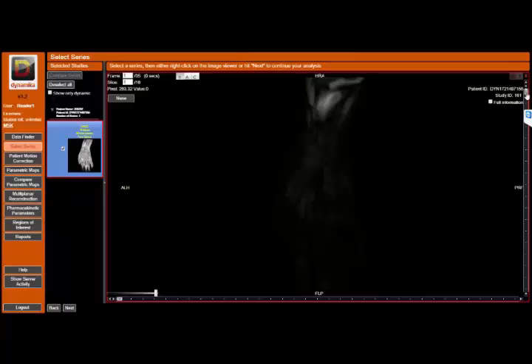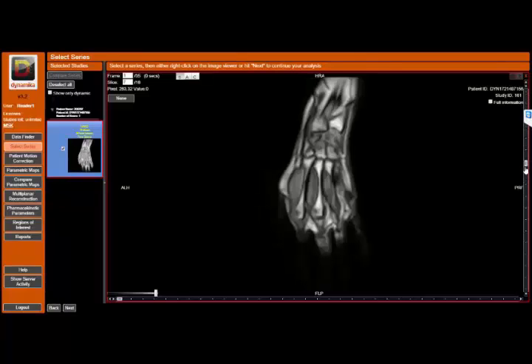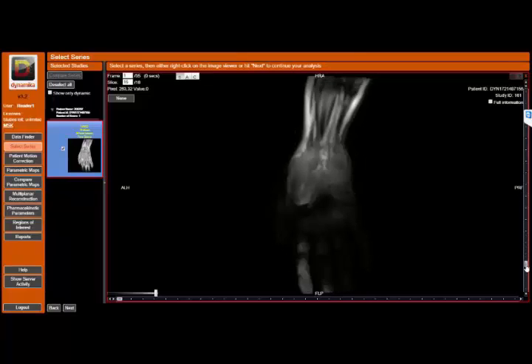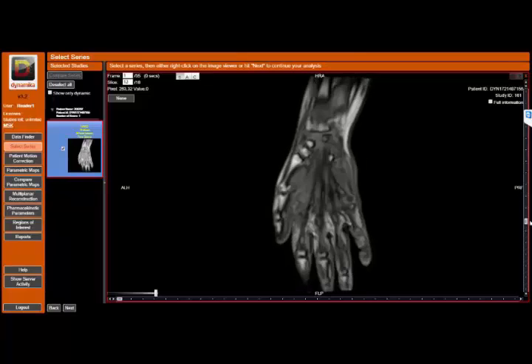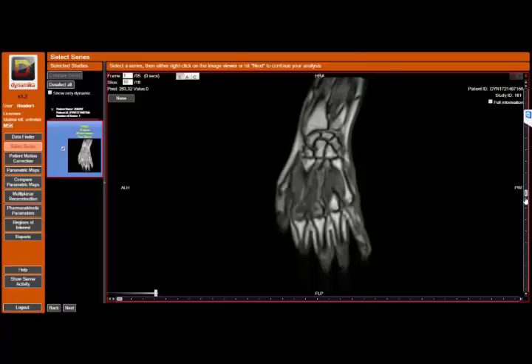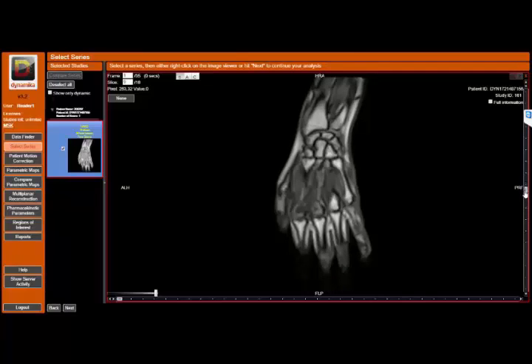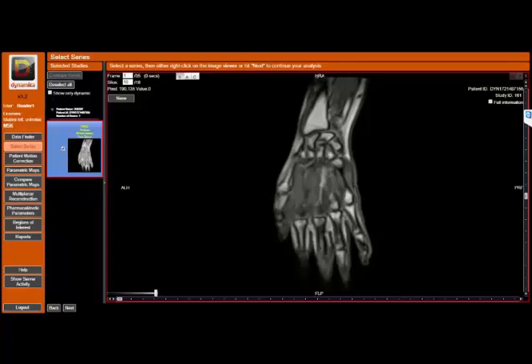What I usually do is upload the series, then scroll through the case to ensure that I have all the interesting slices. I find more or less a middle slice where I can see some of the anatomy. Then I use the lower slider down here to see the time series. As you can see, slowly scrolling through the series, there are some enhancements taking place.